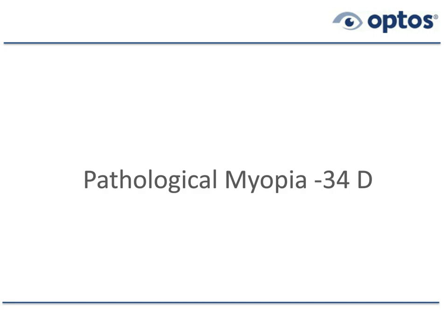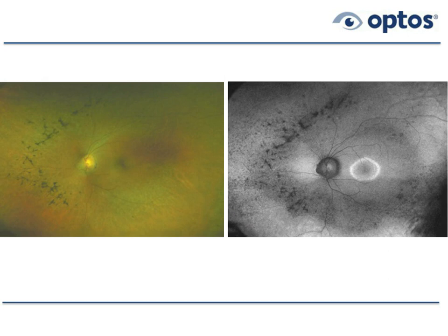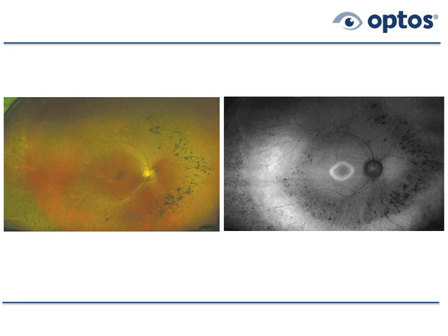A vaguely similar story. It's similar here only because of those rings that we're going to see. Typically, the rings that we see, that I just mentioned to you, are found only in retinitis pigmentosa. The only other condition where we see these sort of mid-periphery lesions can actually occur in high myopia. So here's the highest myopia I've seen in the last 5 years.